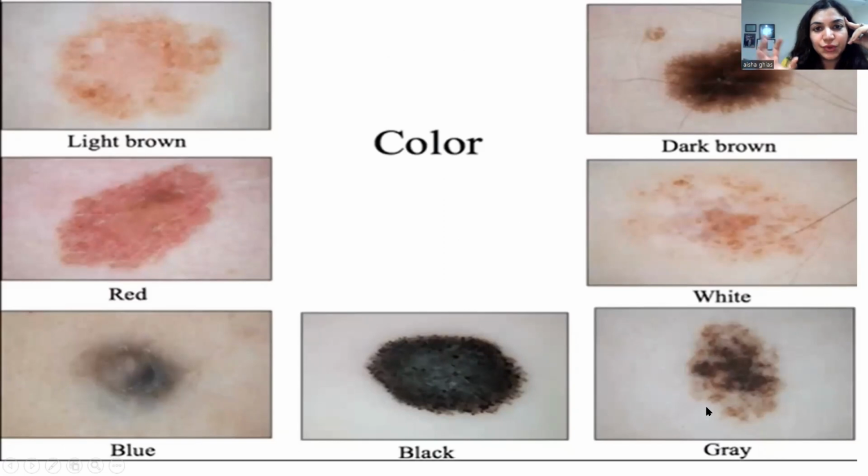Now you will combine these three things, and whenever you are asked to see a melanocytic nevus, or you come across a melanocytic nevus in practice, I would urge you to specifically go and see the melanocytic nevi and practice labeling them. How are you going to practice? You're going to consider the morphology, pigment distribution, and the color.